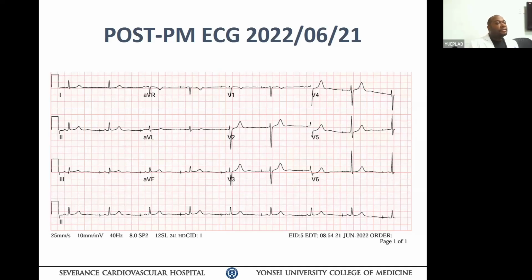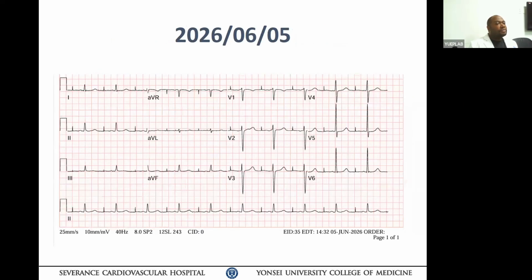It's not uncommon to have this slight delay of 100 milliseconds or 80 milliseconds. Many patients with sick sinus syndrome will have bad scar tissue. Even if the threshold is good, you will have this delay. So you need to keep looking into that. My fellow the other day was presenting Bachmann bundle pacing. The pacing spike was here, but the stimulus to the P wave was over here. I said, how do you know that it's Bachmann bundle pacing with such a delay? So this is a very important concept.